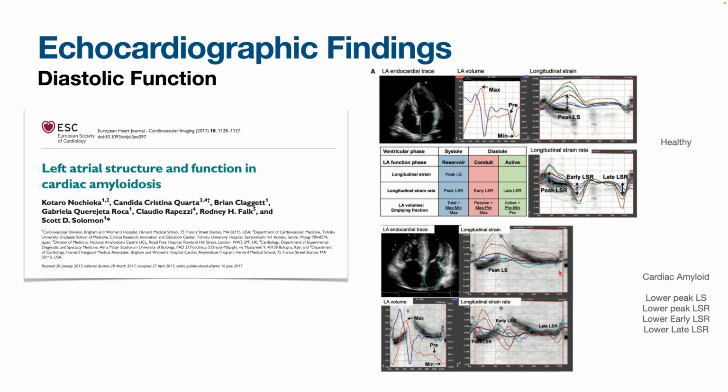So moving along, very rapidly into 2017, when now we have all these tools, and we are now able to measure LA strain in addition to all the other systolic strain and GLS that we do. So here with the newer software, we can actually look at the different LA function phases, including systole, which is called the reservoir function phase, and diastole, which has two parts, the conduit as well as the active phase.